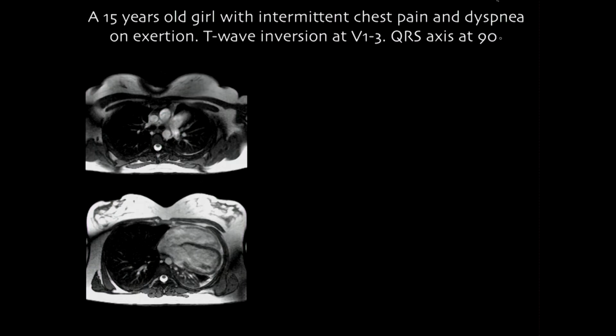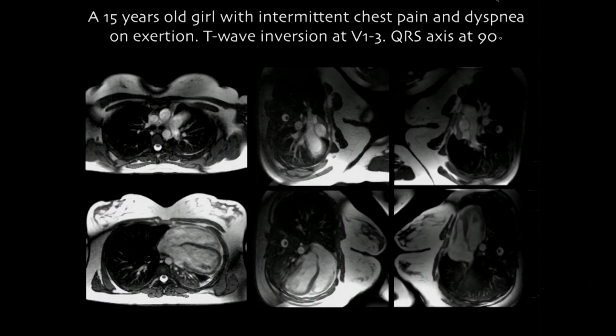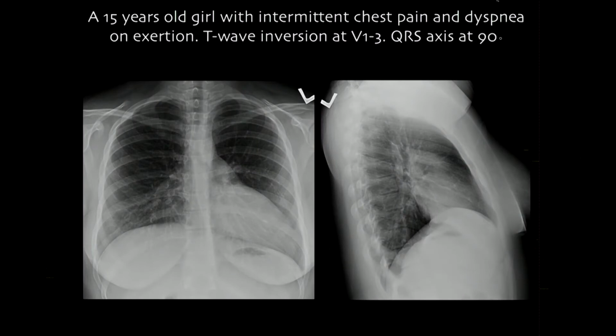Okay? So this is the left lateral decubitus, more displacement, and then right lateral decubitus, a little bit of going backward, because just by gravity it displaces toward the dependent side. Okay, so going back, I'm showing you again. If you have this plain film finding, and the patient can have some chest pain or whatever, some ECG abnormalities, you just declare that it's the absent pericardium. Okay.